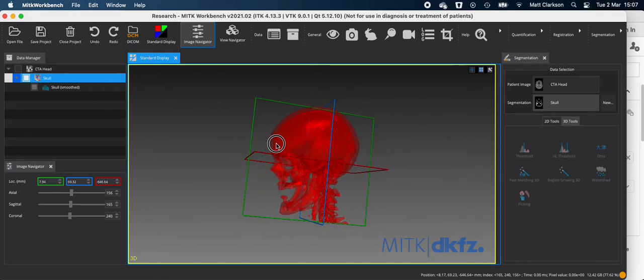So what we can see is in this image, and in CT scans in general, thresholding is quite good for picking things out as long as they have an intensity range that is what you want, or it's unique enough such that one threshold value will work.